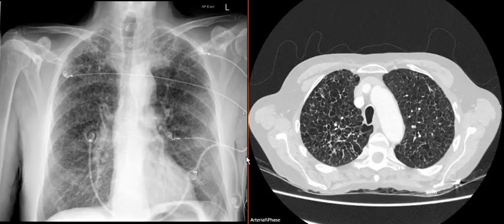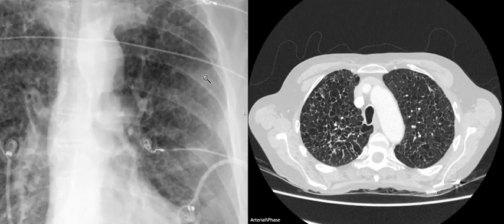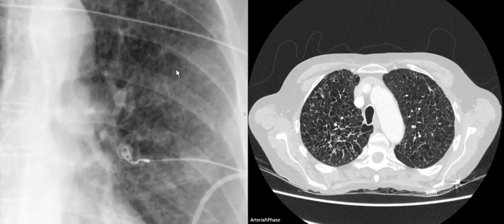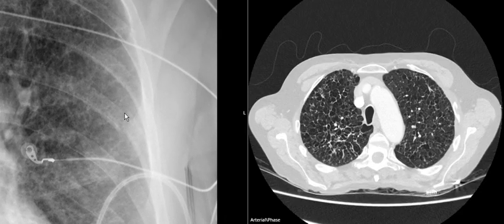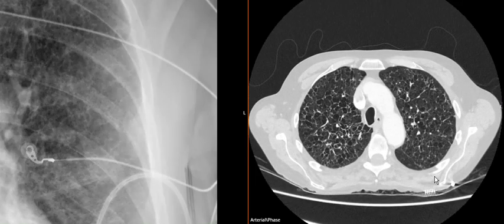One thing I didn't note earlier, but there almost looks like a bit of a gap there, because I think he had a bit of a fall. And if I enhance, see there's a gap in the rib there, and there's a discontinuity between the rib there and there. So there's one there, and you look up, there could be a little gap there. There's certainly a change in angulation here that this wire is running through, and then maybe to some degree there. But sometimes they're more visible on the CT, and sometimes they're not.